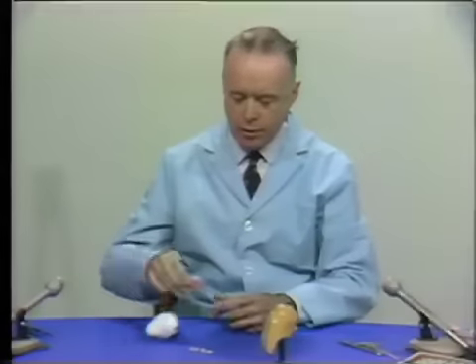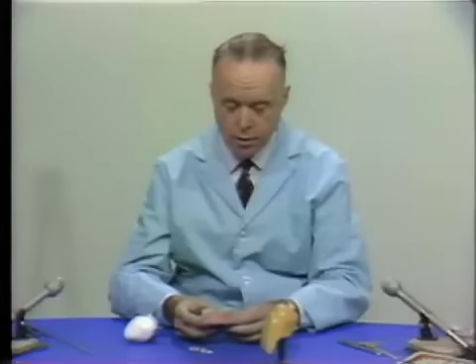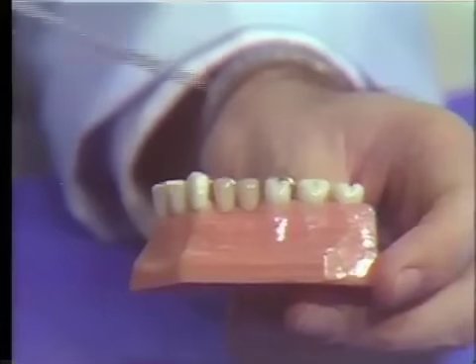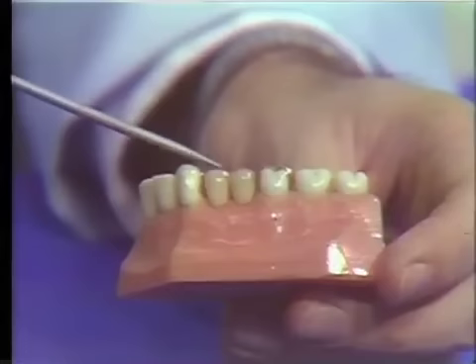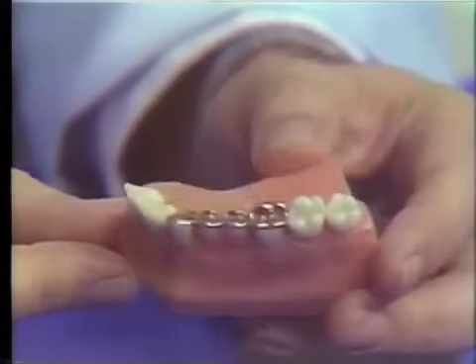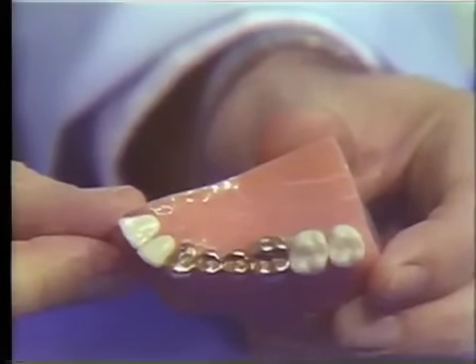We have also here a model which shows a 4-unit bridge replacing 2 bicuspid teeth, which you can see here, and these are replaced with the true Pontic facing. You notice the nature of the gold protection as you see it on the labial there, which has been quite skillfully handled in this case. There's the occlusal view, so you see you've got complete protection there.